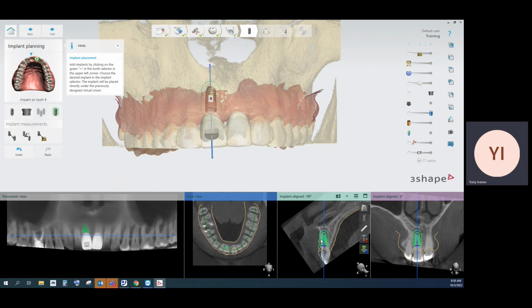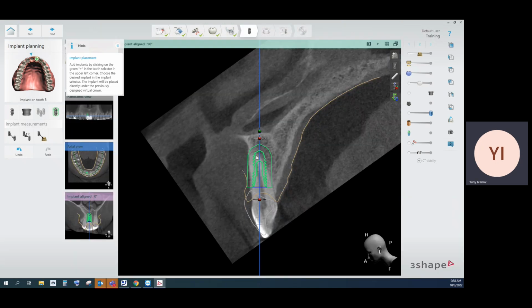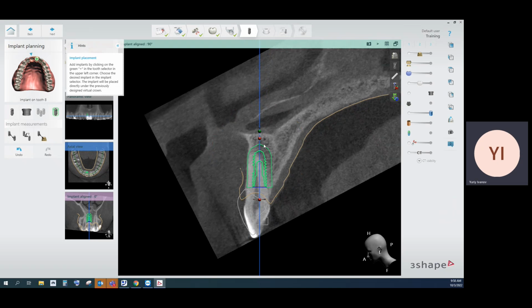So I wanted to extend this one, and probably I need to do a correction, probably not. You could see the placement is pretty good. I could do manipulation anyway. With the red points, I could tilt it out a bit or in, like this, for example, and this is the rotation around the apex, and I could do rotation around the neck as well.